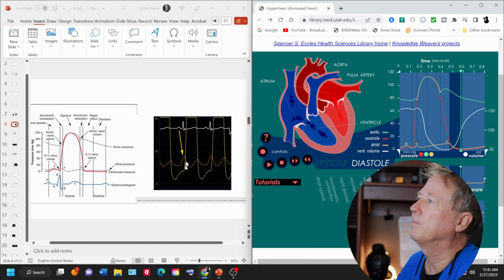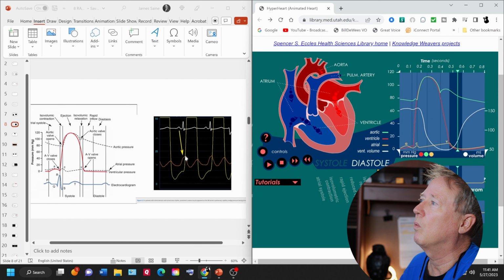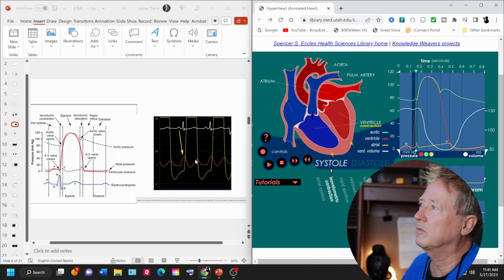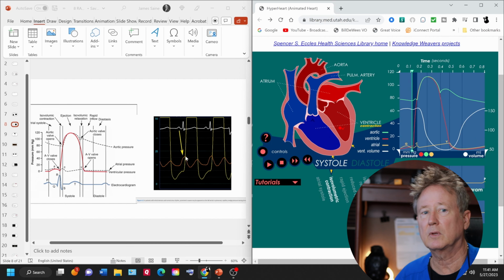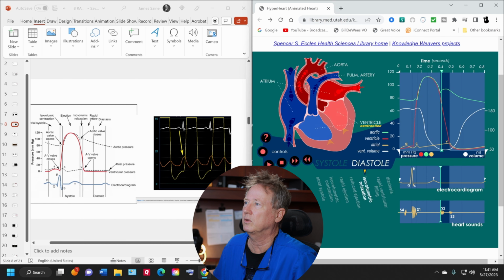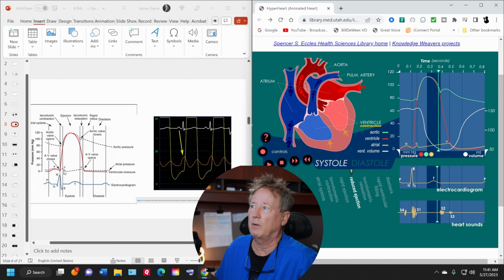And so the question is, this is atrial contraction. So why are you not looking at some sort of gradient around this atrial contraction? Okay, so you have to remember that the atrial emptying is different than the right and left ventricle. So if you're looking at a Wiggers diagram, you may just want to start here, because that's where it starts, A wave, C wave, V wave.